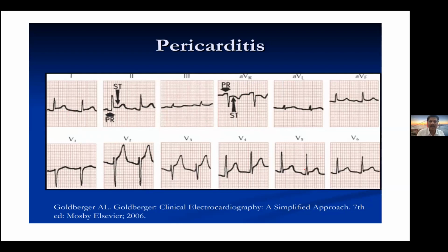And again, this ECG also, see, look at the ST segment. I am drawing, the J point is elevated.